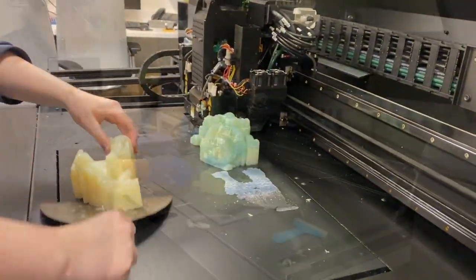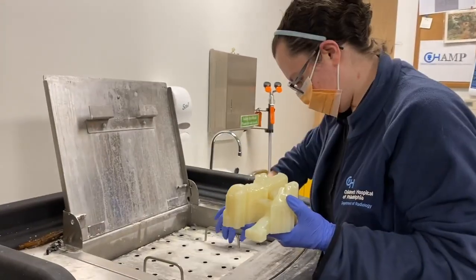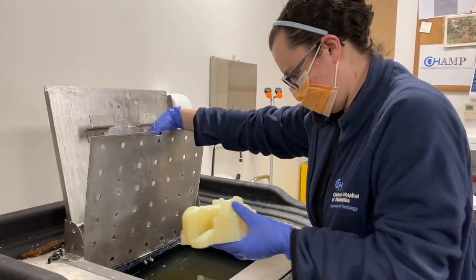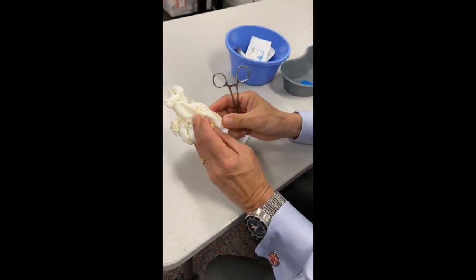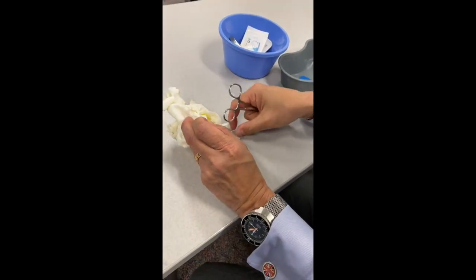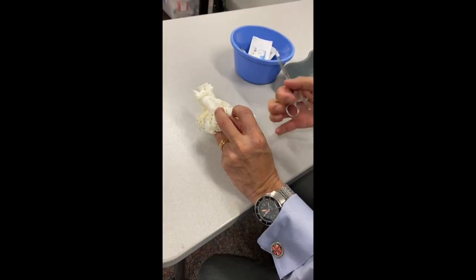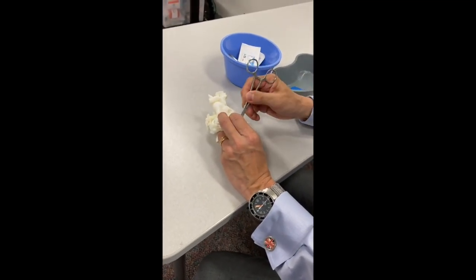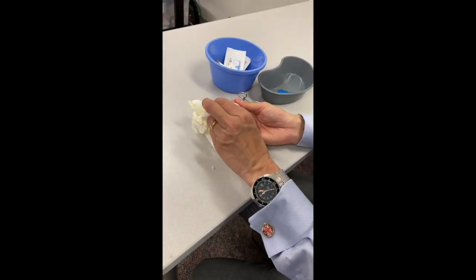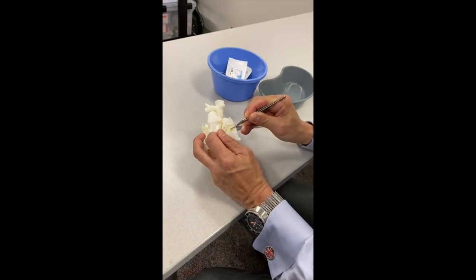The models are also created to scale, allowing the surgeons a more realistic assessment of the intracardiac structures. In this particular case, both the cardiac model and the VSD patch were printed to evaluate feasibility of baffling the LV to the aorta. The flexibility of the materials, as well as the ability to print to sub-millimeter thickness, allows the surgeon to evaluate potential ventriculotomy sites, as well as sites for anchoring sutures.